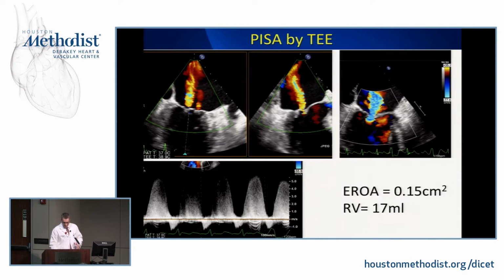That's a beautiful example, this guy here. All right, so here we go. My arrow keeps disappearing. So where would you do it? You want to do it where the aliasing velocity changes colors.